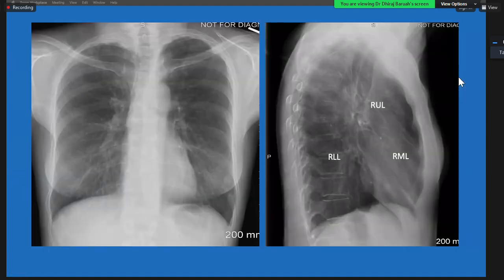So one important thing to realize is that in the frontal radiograph, we have the lower, upper, and middle lobes overlapping each other. If you look at it here, this is the horizontal fissure and this is the oblique fissure. See how high the lower lobe goes. You see part of the lower lobe here. So if you have only the frontal X-ray and you do not have other signs like obliteration of the heart border and other signs to indicate a particular lobe, you usually say upper, mid, or lower lung zones.